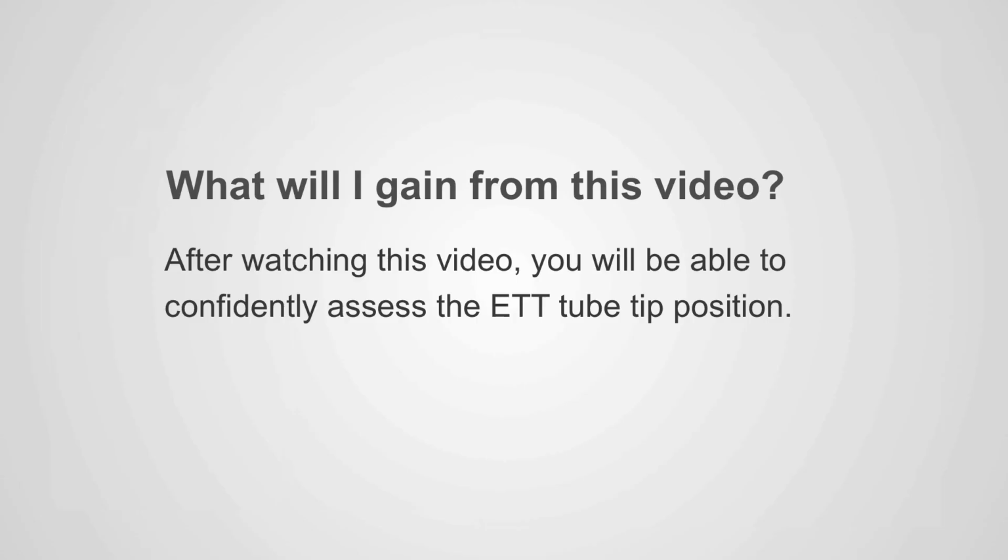What will I gain from this video? After watching this video, you will be able to confidently assess the endotracheal tube tip position. Why is the carina important? Because the carina is the important landmark by which we gauge whether the endotracheal tube position is correct or not.